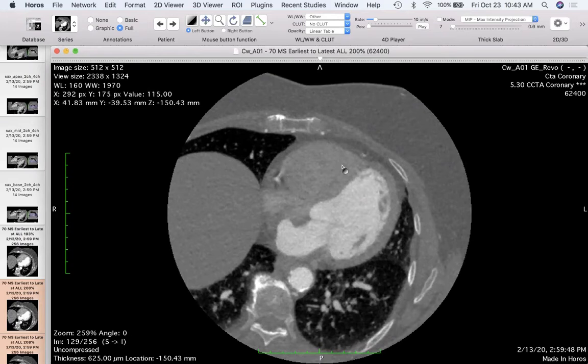For this patient, for example, we have, you know, the left ventricle, right ventricle. It looks like most of the contrast is in the left side of the heart right now, and in the aorta, descending aorta. This is the patient's chest cavity with ribs, right, and their sternum. And you can see there's a lot of space between air and their sternum. So this is actually a fairly large person just by looking at the CT.